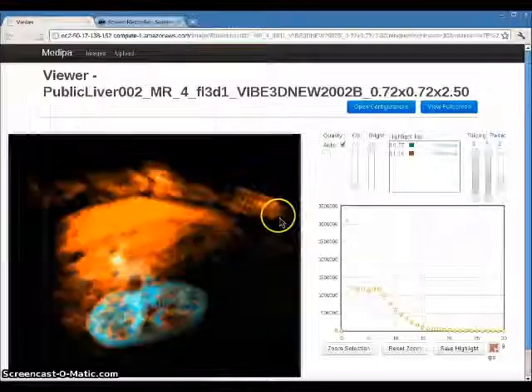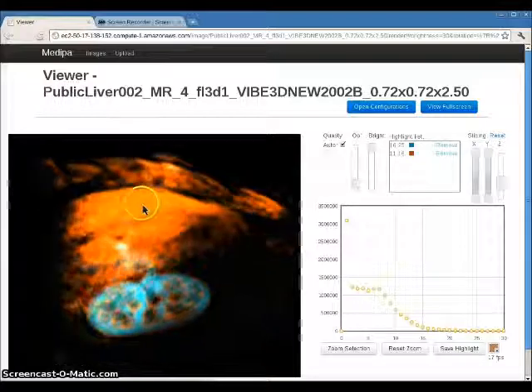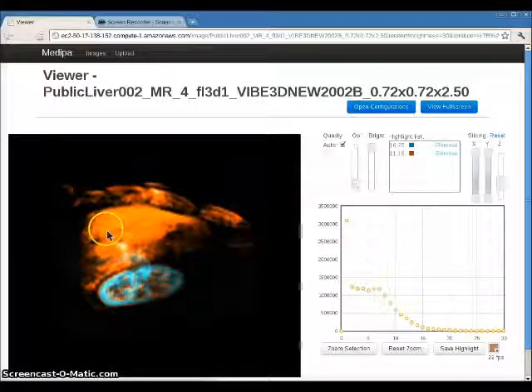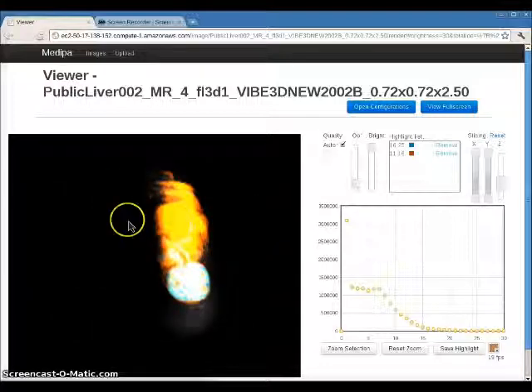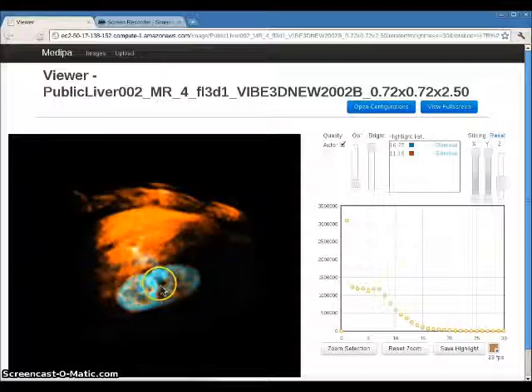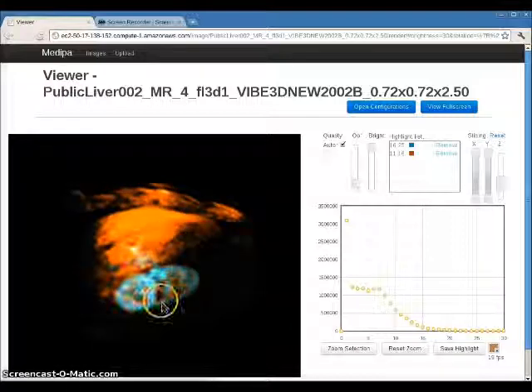And then one last, this sort of shows a zoomed in view of the cavities of the kidneys. And this is actually a fairly thin slice where we're actually slicing into the kidney, and you can sort of see these little pockets. If I was a doctor, I might could tell you what those were, but I am not.